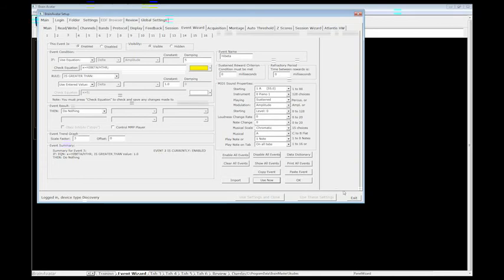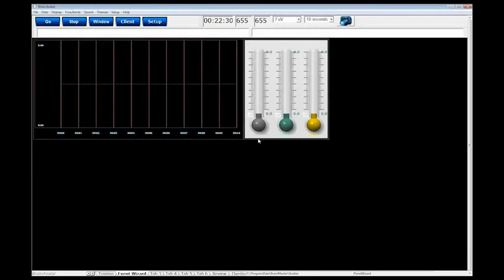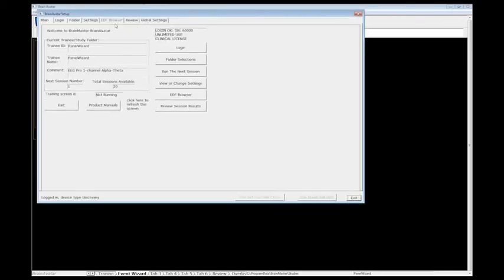Now that I've hit Use Now on it, and once I hit Exit, you see the name is right down here. Part of the reason it's a little difficult to see right now is just the color. The palettes that have been chosen for these aren't the most productive in the world, but the names are displayed right down here.